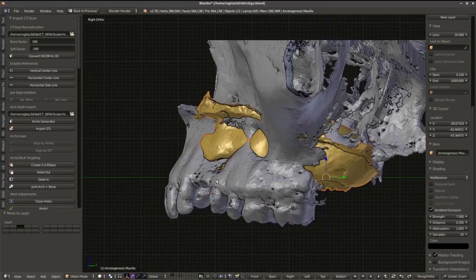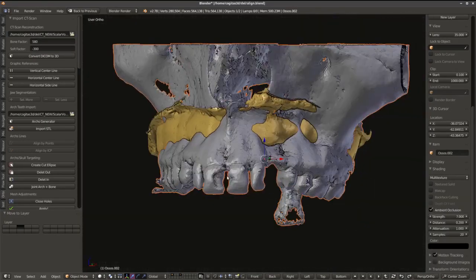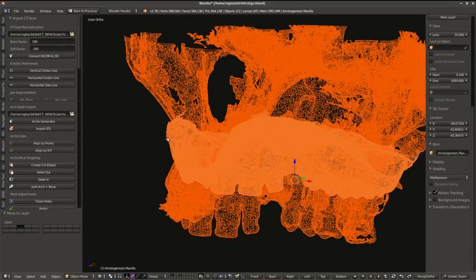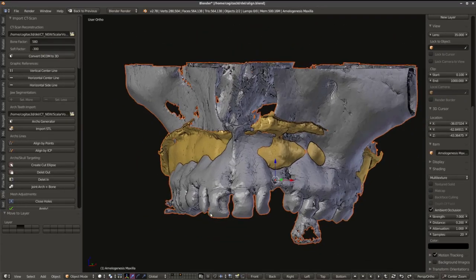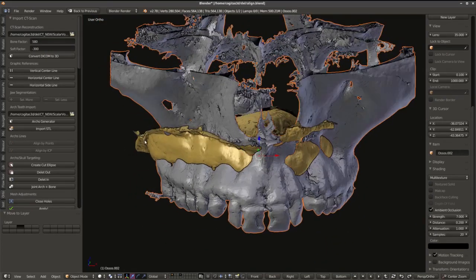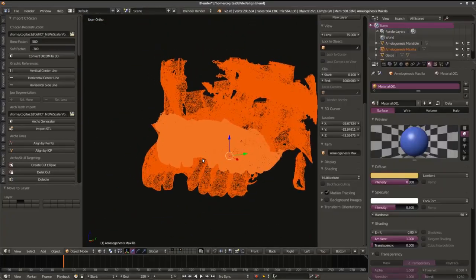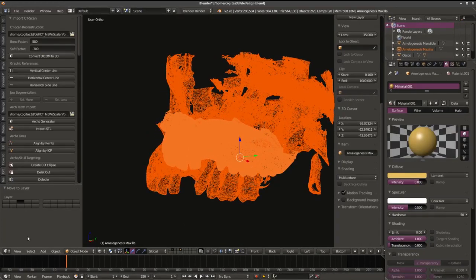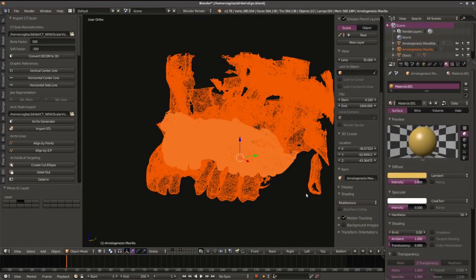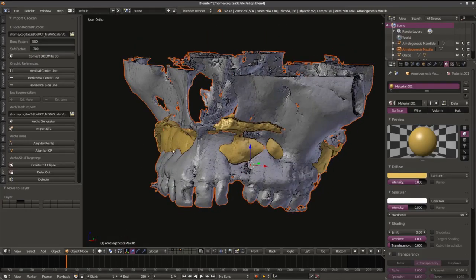Look, okay, so I have to select first the part that will be the same size, and after, the part that will be aligned with the first part. So first I select the bone from the CT scan, and after the cast of the arc. I have to be careful because I may have to maximize the area. I have to unmaximize the area. And now I will click on align. Oh, oops, I have to put it in solid mode.